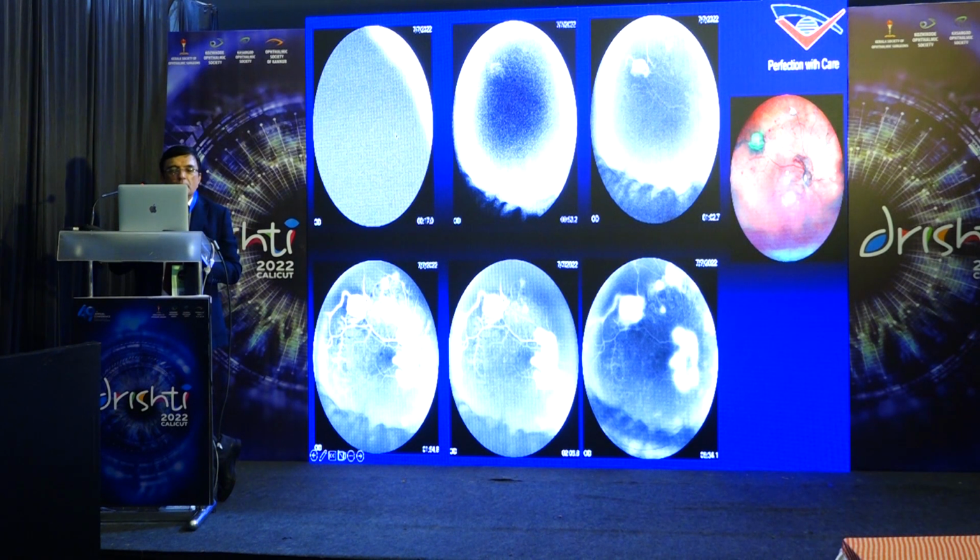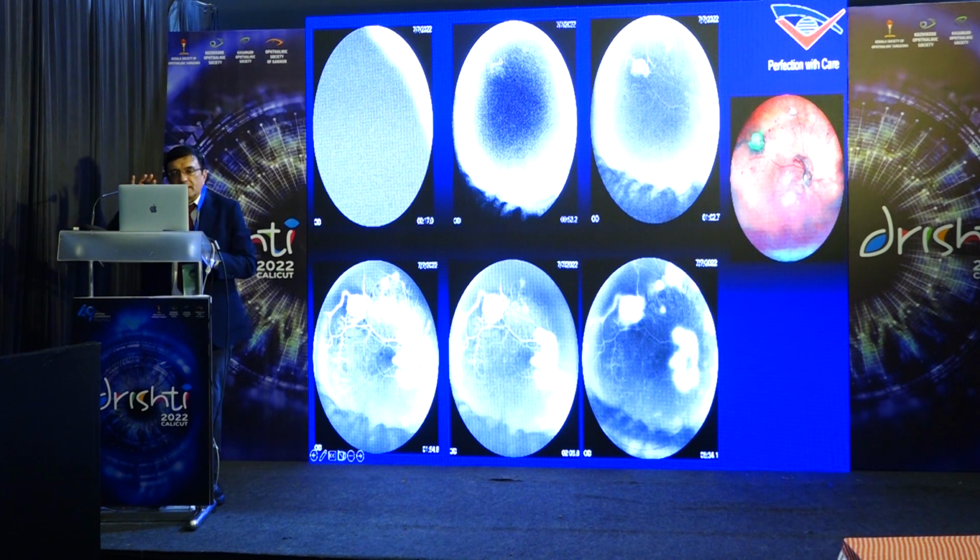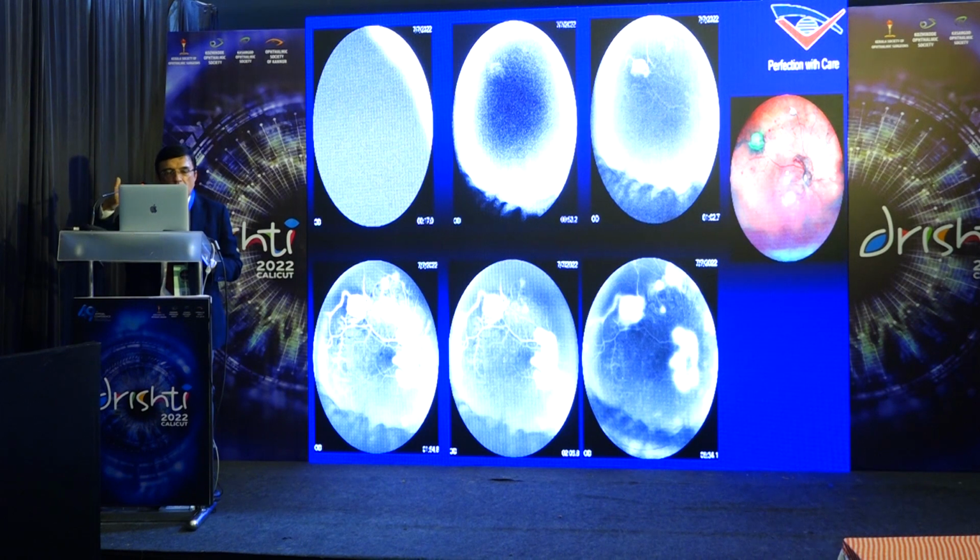So similarly, now coming to reading the angiogram. So this is a patient who had a proliferative diabetic retinopathy, and if you see carefully, this is the choroidal fluorescence which is at 17 seconds. Even as late as about 53 seconds, the fluorescence has just appeared. What does it mean? It means that there is a delay in the arm retina time. That means it is a case of a proliferative diabetic retinopathy with an addition of a possible ocular ischemic syndrome.